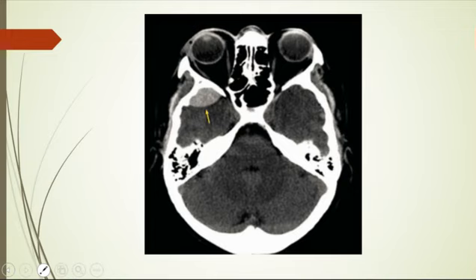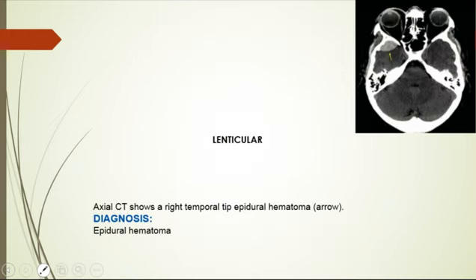What's this? It's a lenticular lesion. Okay, lenticular appearing lesion suggesting epidural or extradural hematoma. There is a right temporal tip epidural hematoma suggesting epidural hematoma.